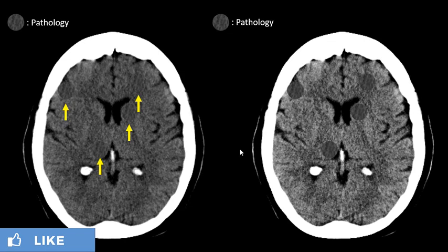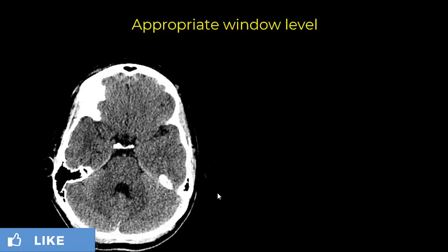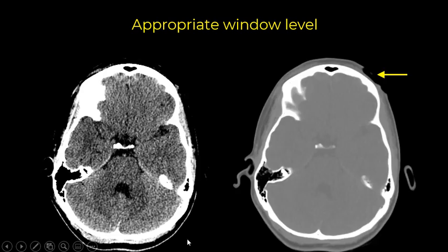And now we'll give some real life examples. So if you're reviewing this CT scan and checking the brain parenchyma very well, you will not be able to see the soft tissues simultaneously. This is the exact same level, now windowed differently. We can no longer see the brain parenchyma very well, however, we see the soft tissue abnormality.